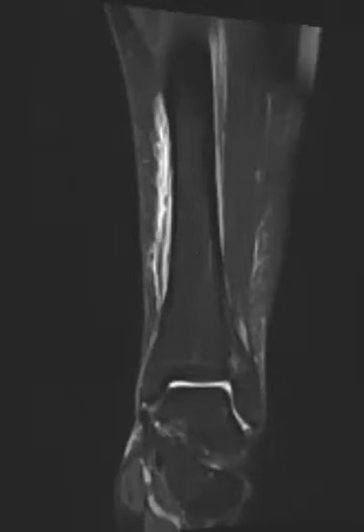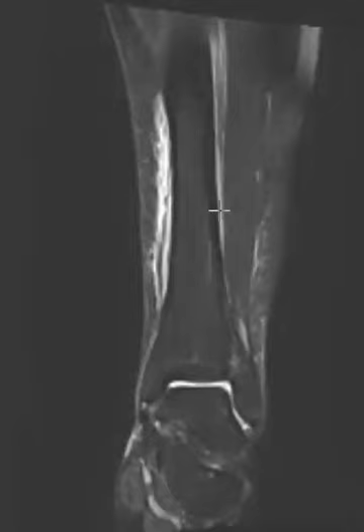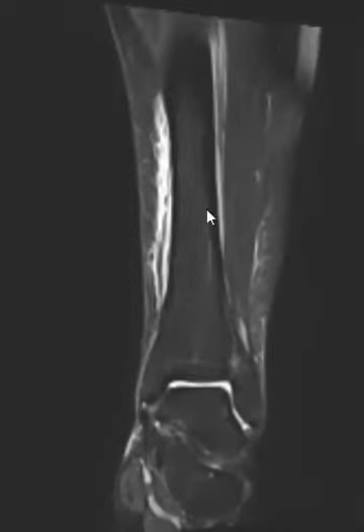So just to recap, on the low end of the spectrum for tibial stress syndrome, we just call it shin splints or mild tibial stress syndrome with periostitis. And then if there's marrow edema, you just say there's stress reaction with marrow edema, but no evidence of a stress fracture. And then again, the severe end of the spectrum, say there's a horizontal transverse stress fracture of the tibia with prominent marrow edema. And that's it. So again, these are all parts of tibial stress syndrome.